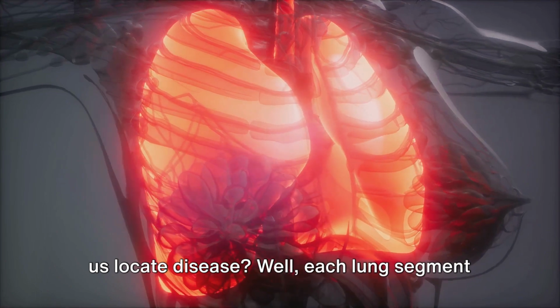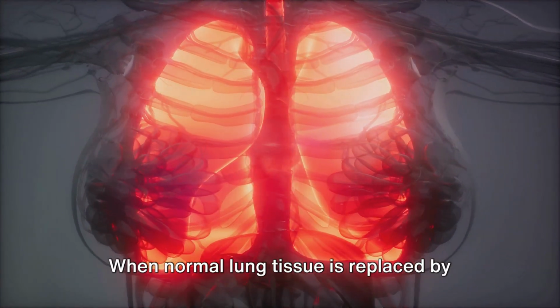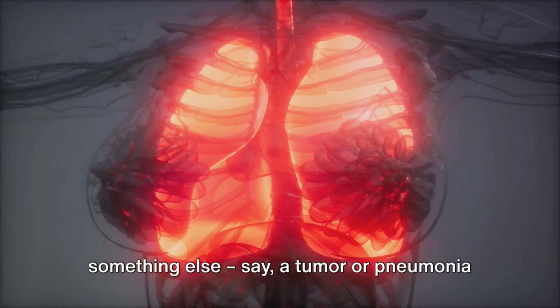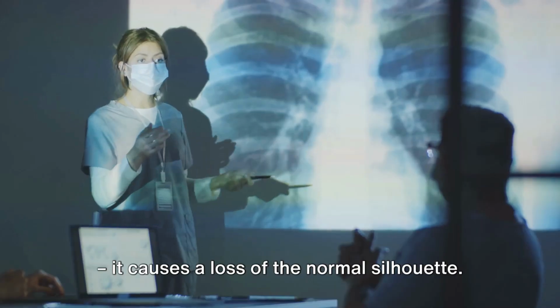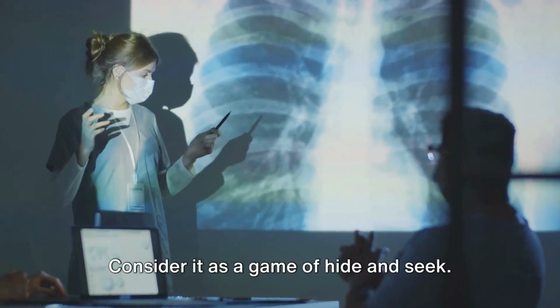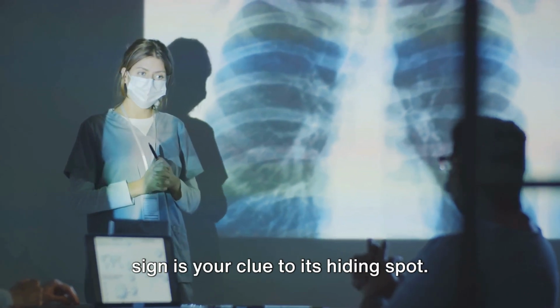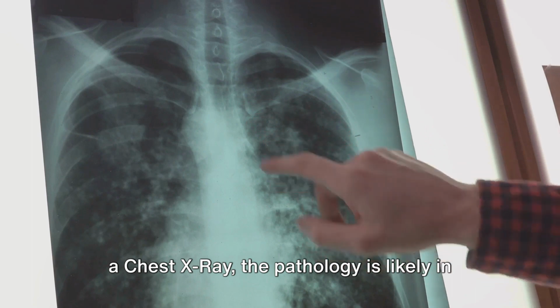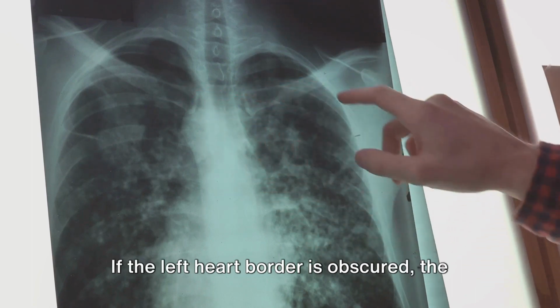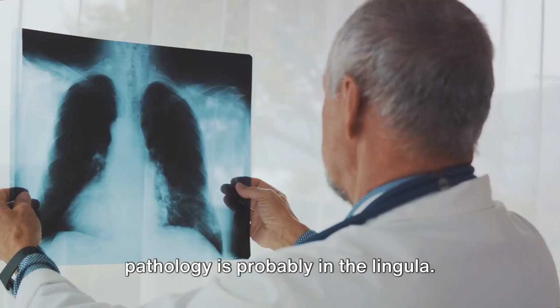Well, each lung segment has particular interfaces with other structures in the chest. When normal lung tissue is replaced by something else, say, a tumor or pneumonia, it causes a loss of the normal silhouette. Consider it as a game of hide and seek. The disease is hiding, and the silhouette sign is your clue to its hiding spot. If the right heart border is obscured on a chest X-ray, the pathology is likely in the right middle lobe. If the left heart border is obscured, the pathology is probably in the lingula.